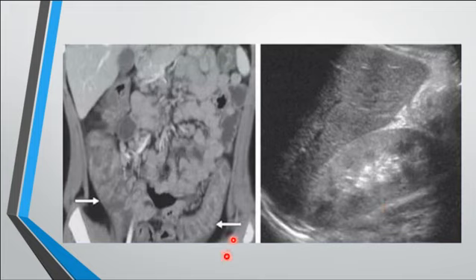What's going on in the CT? Anyone? Just describe. What do you see? There are multiple patchy hypodense lesions on the wall of the small bowel, patchy hypodense lesions on the wall of the descending colon, and also in the cortex of the kidney. The kidney is enlarged and echogenic. That's it for the ultrasound, leave it now. Let's talk about the CT scan.